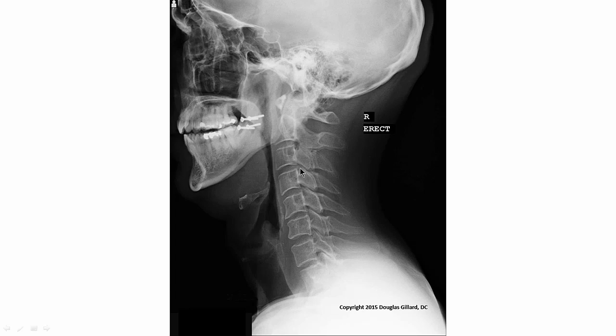Okay, now we go back to these things right here. This one is the superior articular process of number 2, 3, 4. Superior articular process of 4. Inferior articular process of 3. Third vertebra. Articular pillar is the whole ball of wax. You can see why they're called the articular pillars, right? They literally look like a pillar of bone here. Spinous process is back here.